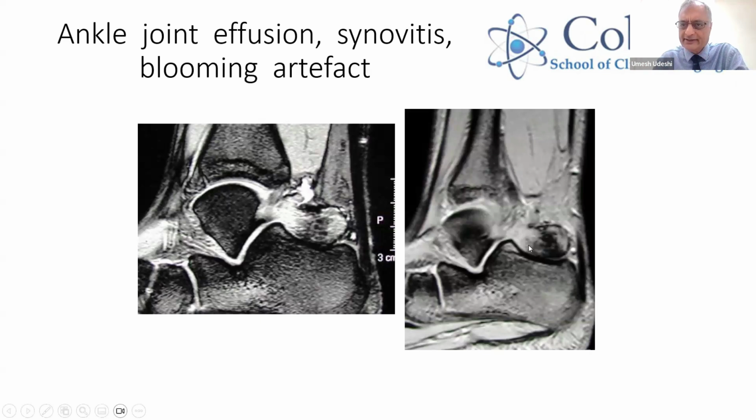I think the one on the right is a gradient image T2, and this is a spin echo T2. What we're seeing, not only some fluid, so this white stuff is fluid, and it's sort of almost encapsulated here at the back, but there's also some dark stuff in it, and it looks much darker, if you will just take my word for it, on the gradient T2 image.